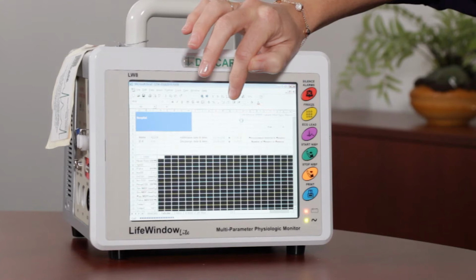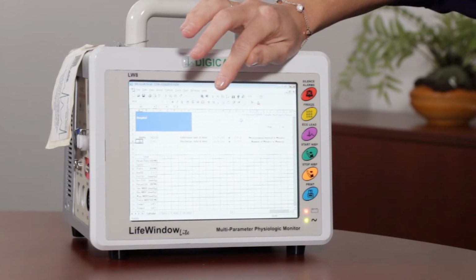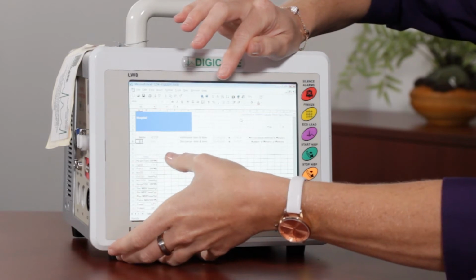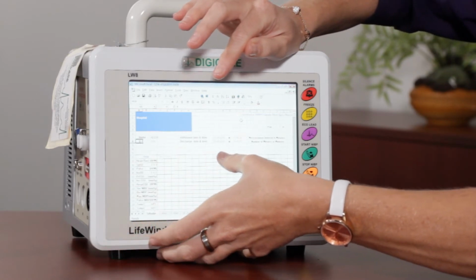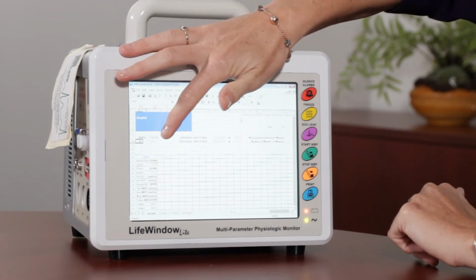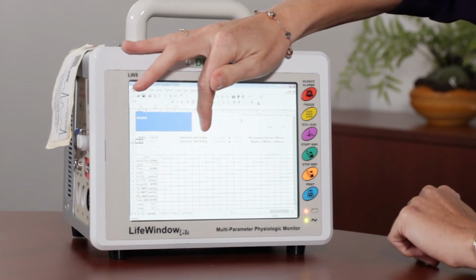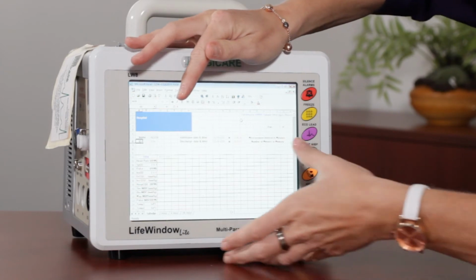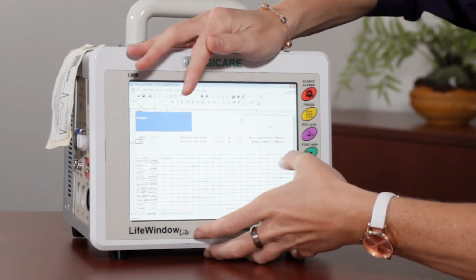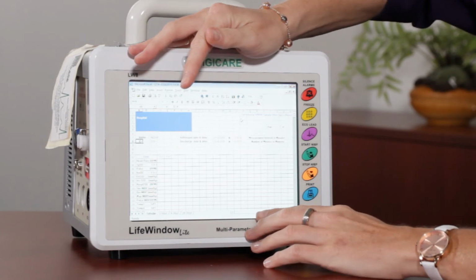The screen is going to flash a little bit. Then on the top, you're going to see the time intervals have changed from every 5 minutes to 1 minute. Also on this report, you're going to see Reggie's name, his ID, the time he was admitted, the time he was discharged, the number interval of minutes, and the memory minutes, so how long the actual procedure was.